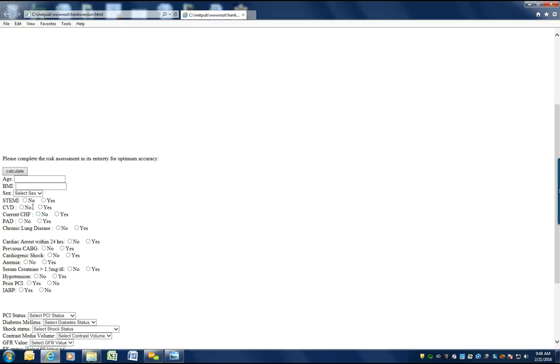Once the clinician puts in the information on the patient, the risk scores will populate on the bottom as well as graphs above highlighting the values. It's important that the information is correctly inserted. This is information that the clinician should have in front of them, easily accessible anyway.